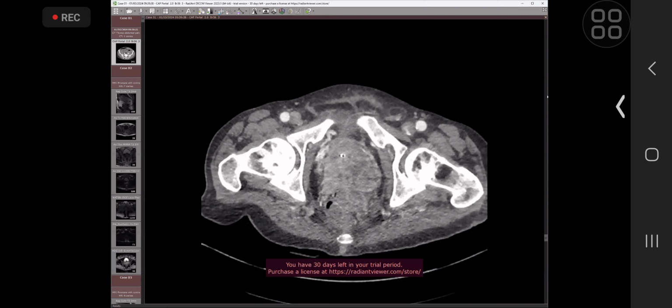And I've deliberately started with a case that is CT, which we're more familiar with for most of you, and to move into the other topics. Okay, so that's the end of the imaging review for case one. So let's move on to some discussion about this, and then we'll start the rest of the slides. So I'm going to switch back now to PowerPoint here.